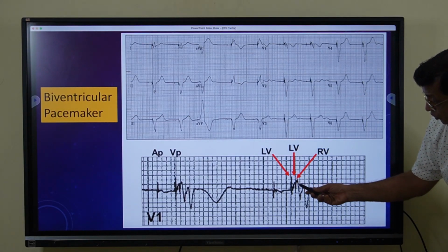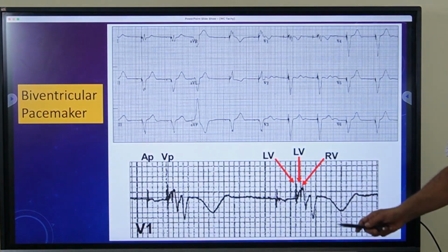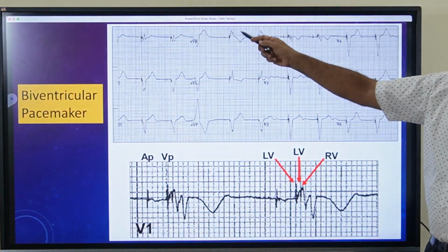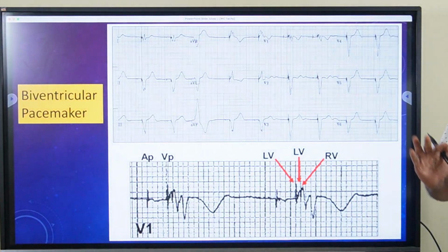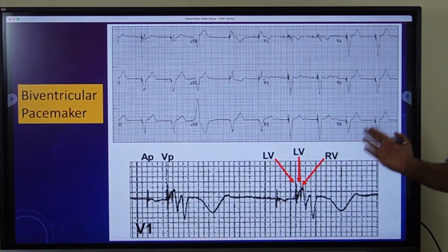Whenever there is biventricular pacing, pacer tracing here, and in this you see tall R wave in AVR. So in biventricular pacing there could be northwest axis. So these are the two exceptions for a northwest axis in a wide complex tachycardia for ventricular tachycardia.